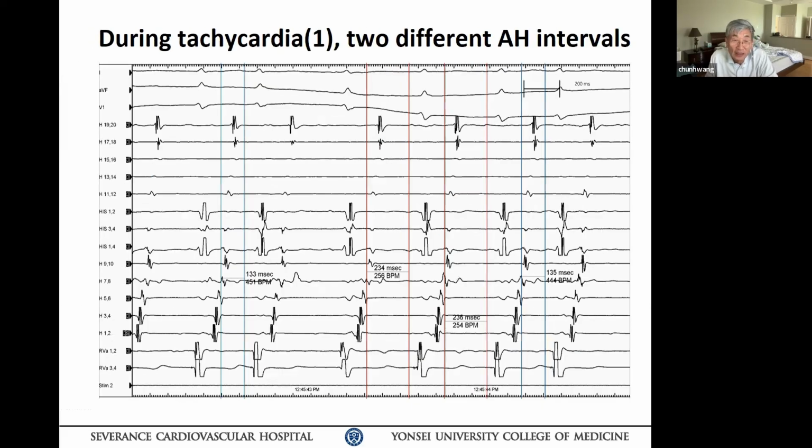Yeah, this one. So you paced 2 beats, or is it just the normal tachycardia going on? Is the tachycardia going on? Right? Yes, the tachycardia. During the tachycardia, you have 2 different groups of VA conduction or retrograde activation, timing-wise. The second beat and the last beat. Right? Yes. Second beat, last beat. And what's the difference here?